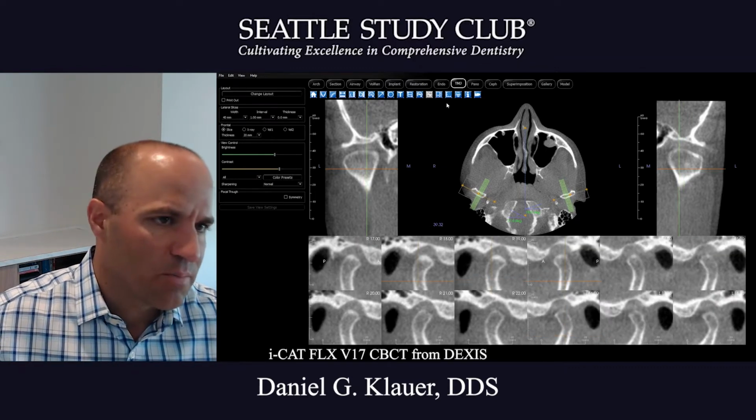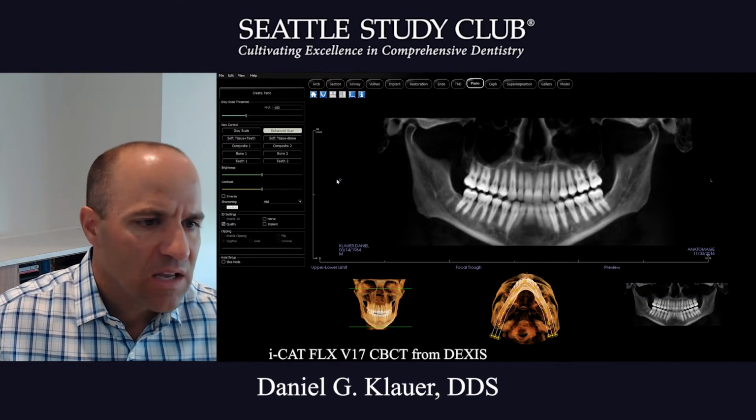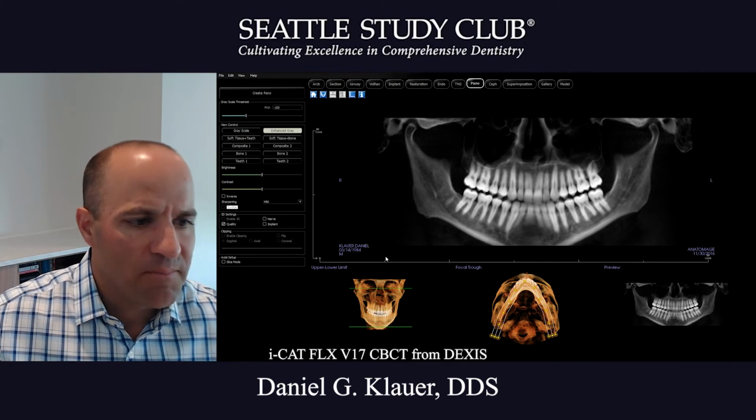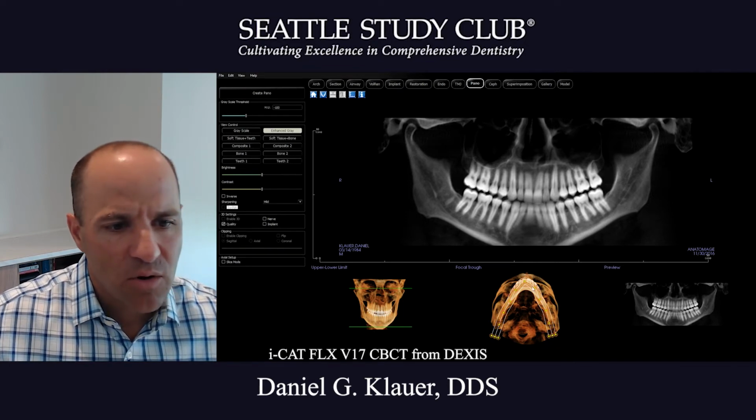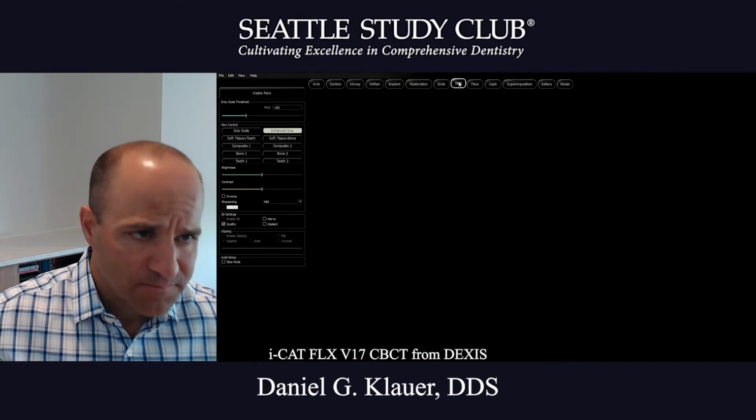And this is great to show the patient. And the pano view is what patients are commonly used to seeing. And you can do an automatic pano, or you can manually create it as well, depending on what you want to look at.